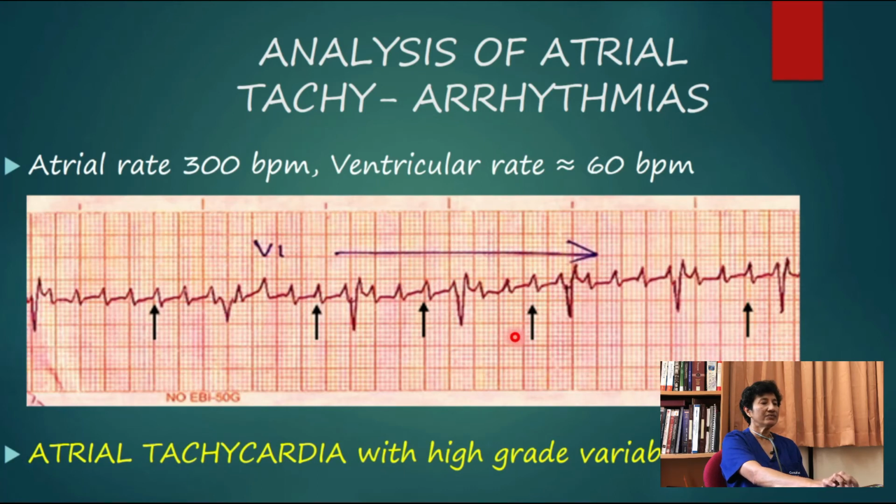So what is the electrophysiological mechanism? This patient has developed atrial tachycardia, and simultaneously the patient has clinically significant AV node dysfunction. If the patient is not already on rate controlling drugs or antiarrhythmic drugs, this could be a case of tachy-brady syndrome.